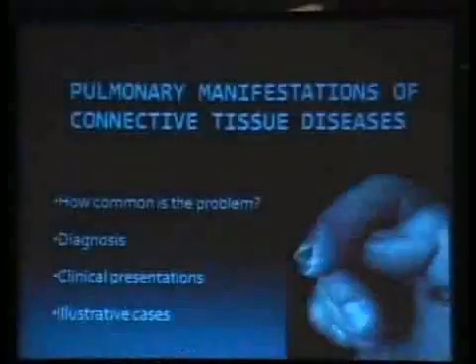This is a biopsy that is representative and not from this patient, and here you can see that these are the honeycomb cysts that are lined now by metaplastic epithelium. There's a small section of relatively preserved lung down there, and there are areas where the interstitium is widened by collagen deposition. So this is the end stage of systemic sclerosis in the lung.